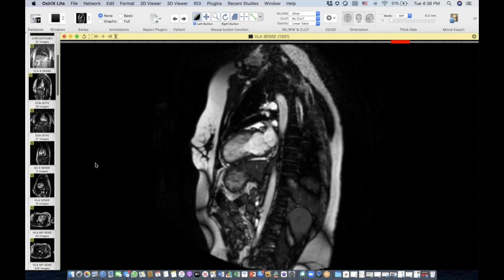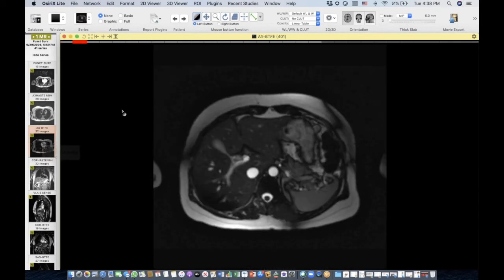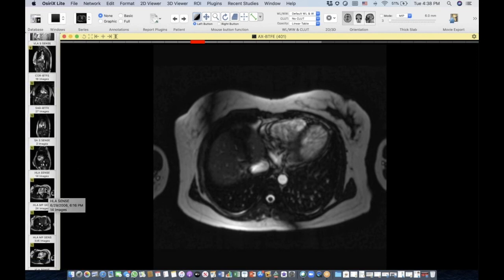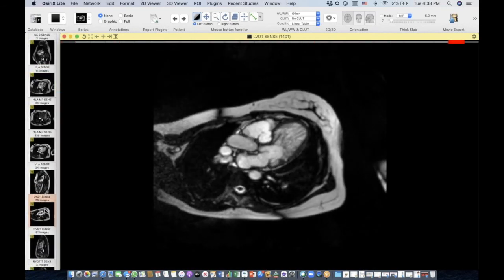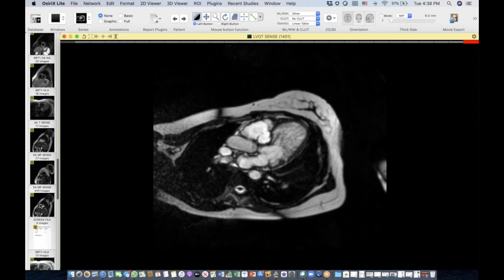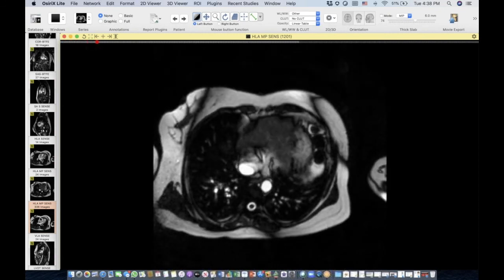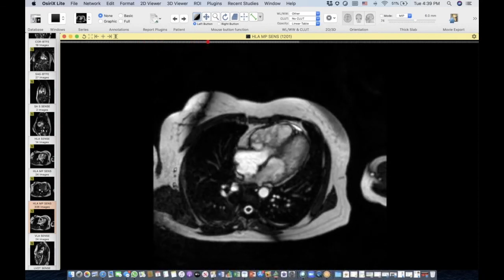But that's not all. The really interesting part in this case, that was kind of like an incidental finding actually, is here. Where are my 4-chamber movies? Let's see. Maybe this one? No. Sorry about that. Let's see this one. Yeah, it just has to go through the heart. So look at the right chambers.